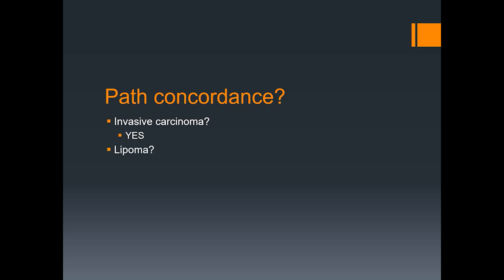Will a lipoma be appropriate here? Probably not. A lipoma usually doesn't have such irregular edges. It usually has a more uniform internal increased echogenicity. And I would say in this case, the relative vascularity, the hypoechoic center, and the irregular edges would probably decrease the likelihood of a lipoma significantly.